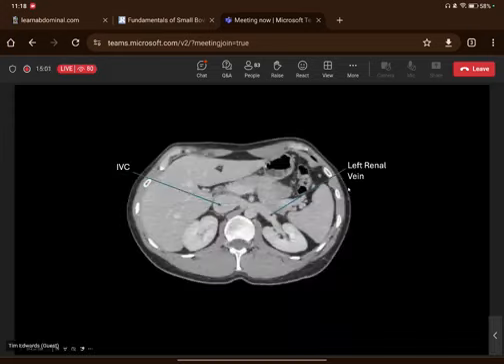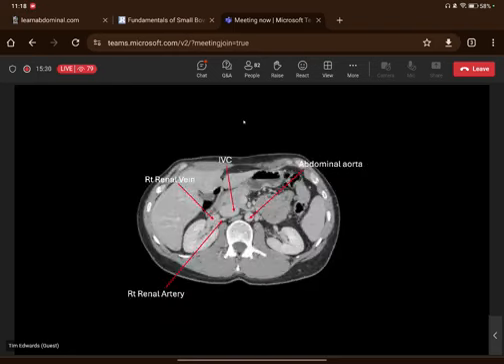So I've just included an axial CT here. As we can see here, this is the inferior vena cava on the right side, and then this is the course of the renal vein. You can see most of its course running anteriorly, in normal anatomy, to the abdominal aorta, draining into the inferior vena cava. And then this is another slice to show a few more structures that you might see in a single slice on an axial CT image.